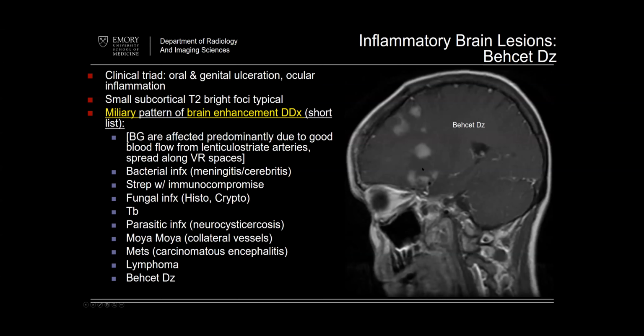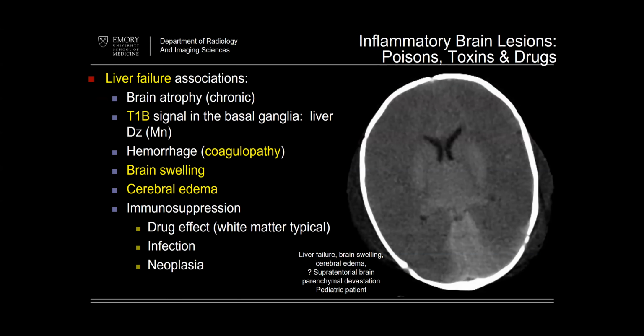Here's a patient with Behçet's, in sort of a classic vasculitis vasculopathy look. After I show you several of these cases, you probably are starting to see, if you've never seen this before, kind of that amorphous sort of clustered look of enhancement, which is more typical for this. Is it pathognomonic? Sure, it is not. I don't believe in pathognomonic anyway, but it's definitely something to consider and to lean on the gradient to figure out what's going on there.